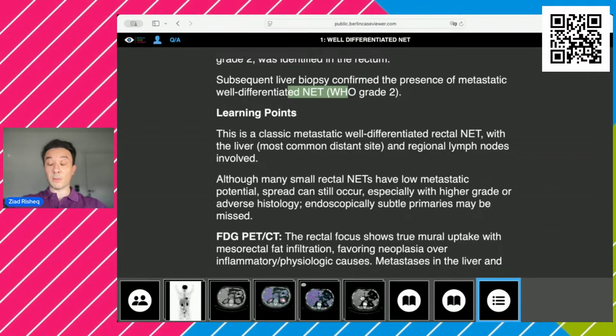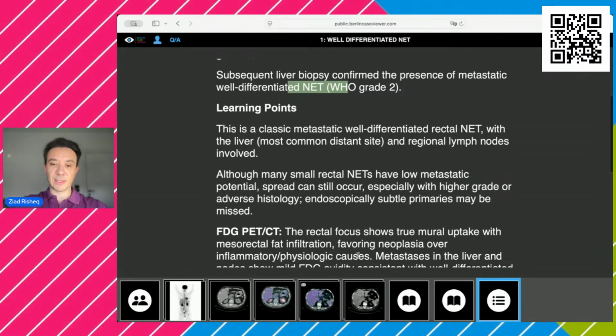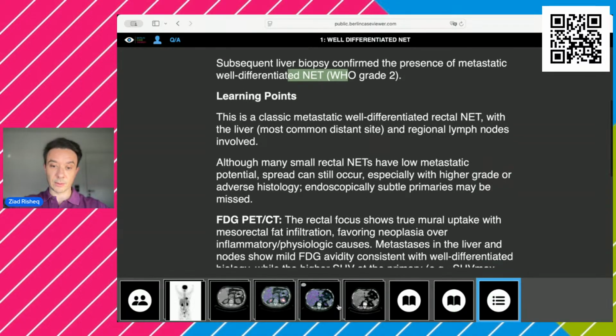You have a probable rectal lesion, and it is showing uptake with the radiological evidence that there is an abnormality there, and you have these hepatic hyperdense lesions. Definitely they are not cysts. Definitely there is a pathology there. And they're showing low grade or mild to moderate, or you can even call them mild uptake. You have to think of neuroendocrine tumor in these cases. And it was actually based on my opinion that they reviewed the histopathology, and it was actually a neuroendocrine tumor.